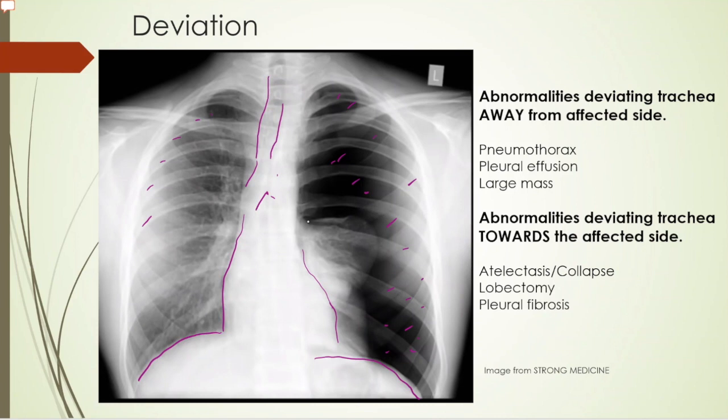And you can see the lung right here. So that lung is pretty much totally collapsed there. This patient needs a chest tube like 5 minutes ago. I would imagine his vital signs are starting to show this because that's a lot of pressure that they're putting on the heart and great vessels.